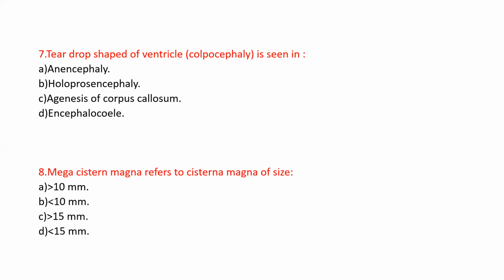Sir has got disconnected. Again we will have to evaluate the fetus by neurosonography, and we have to find everything. Ashok sir, please say about the outcome of mega cisterna magna. And would these have to be referred to find the mega cisterna magna?